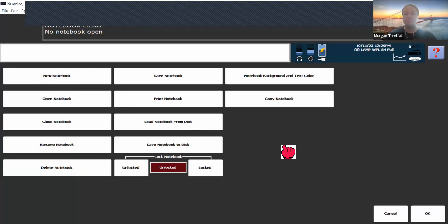We've got some AAC ambassadors that work for us, and they will complete presentations to speech therapists, families, universities, and they do that in the notebook feature. So you can open a notebook, construct your presentation, save it, and then you only need to open your notebook and press play, and you can deliver your speech all in one go.